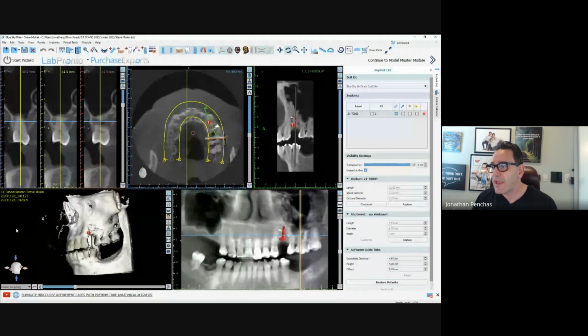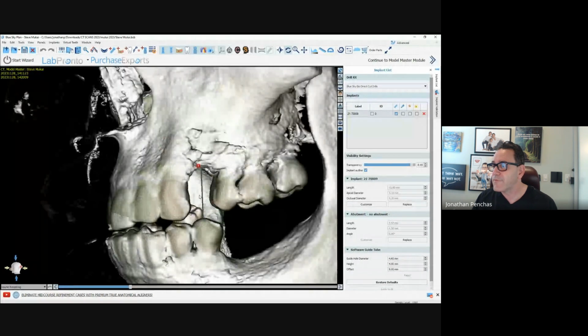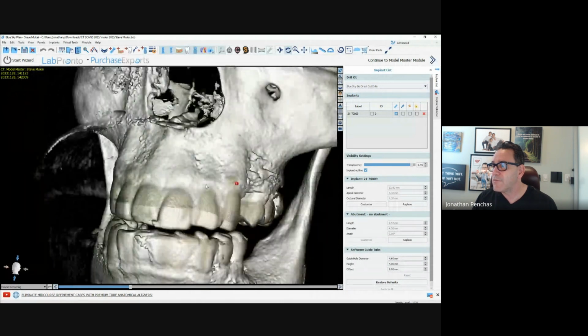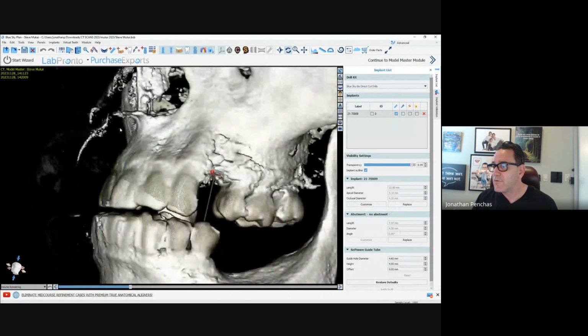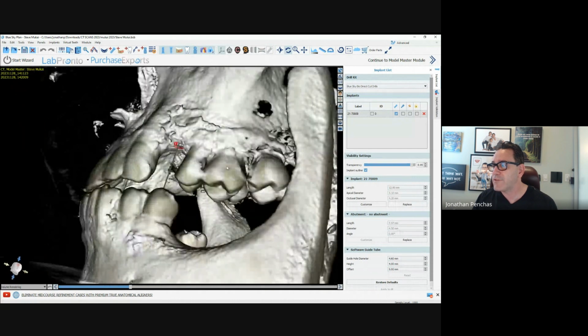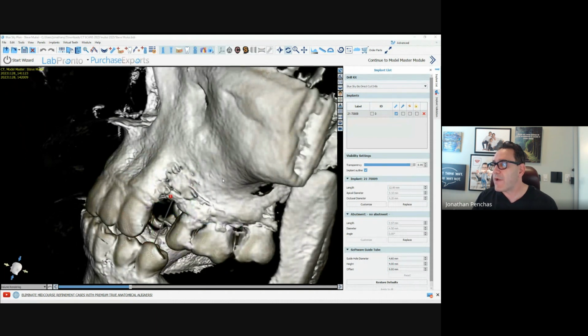Again, I can look at their 3D and see if there's any bone problems. Again, we talked about infraorbital. We talked about perio can be diagnosed or helpful to diagnose, but not diagnosed. And then thickness of the bone. So that's about it for this idea of reading for today.